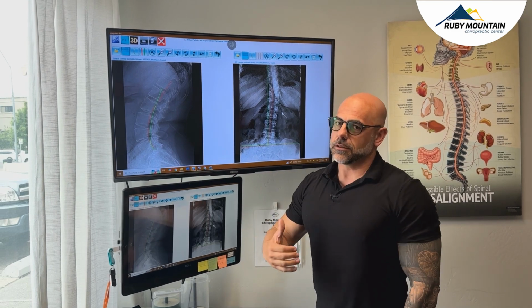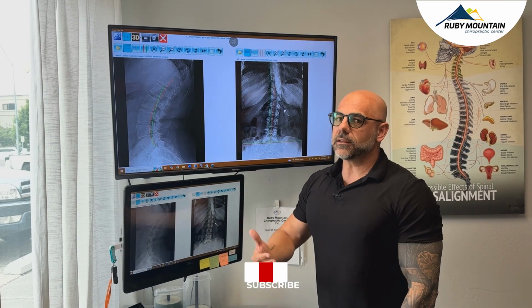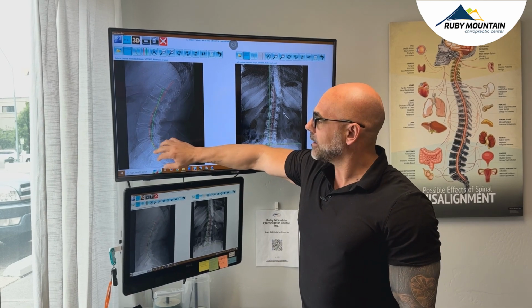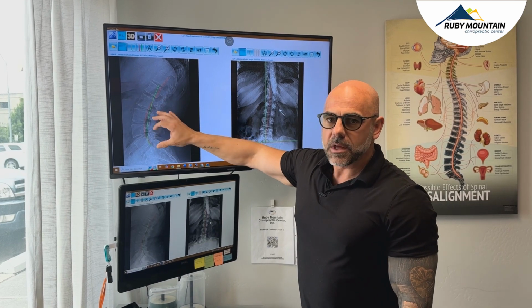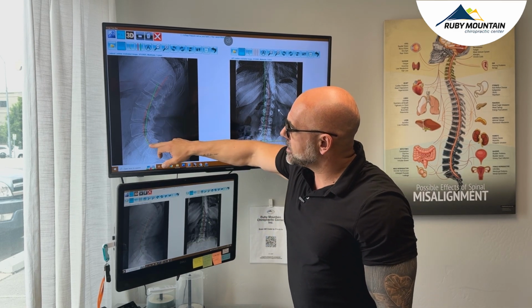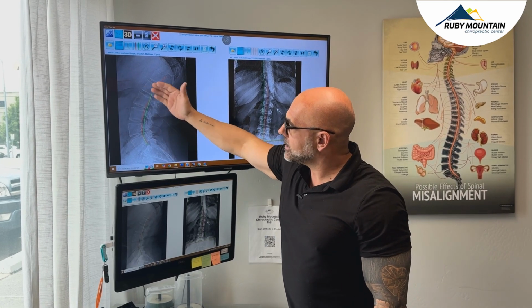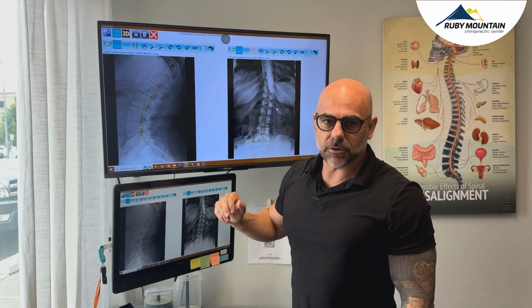As I mentioned before, there are a lot of normals in healthcare, like a normal blood pressure, normal blood labs, normal height and weight that's desirable, and like that, this is the desirable position for the low back. Now, this is an ideal position, but we can strive for this as a clinical outcome if somebody does desire. More specifically, if we go back, this abnormal position, this red dash line you can see is off the green line, is actually what's putting pressure on pain-sensitive tissues, like discs, like muscles that surround this area, and the vital nerves that come out of each and every one of these areas.